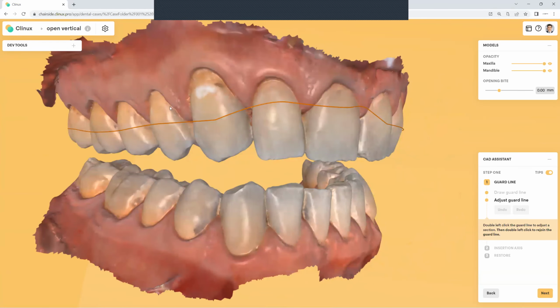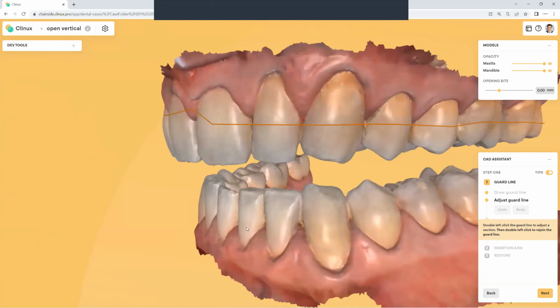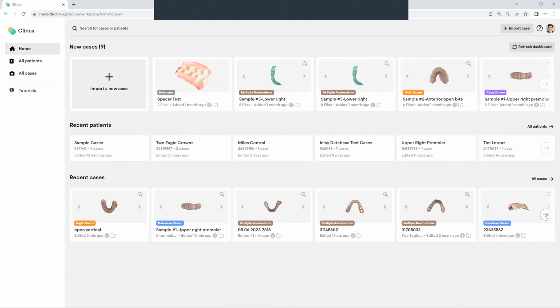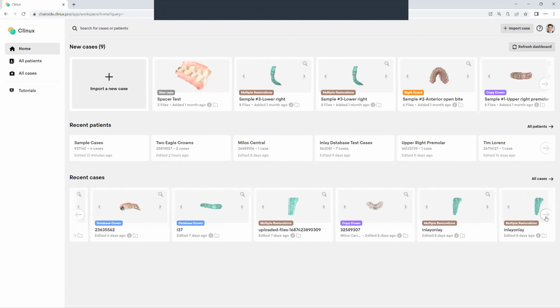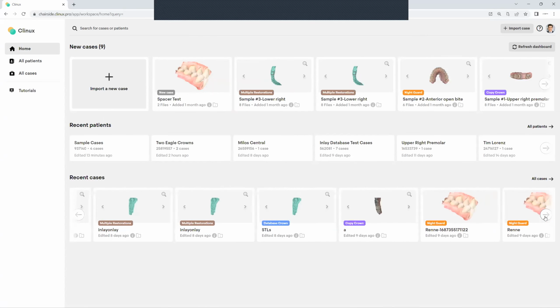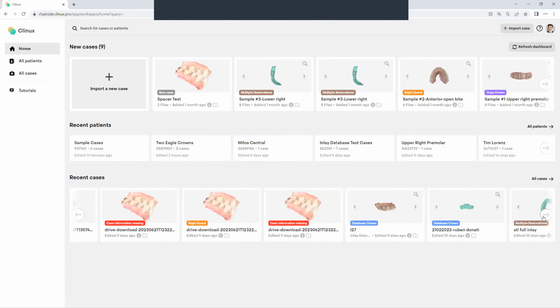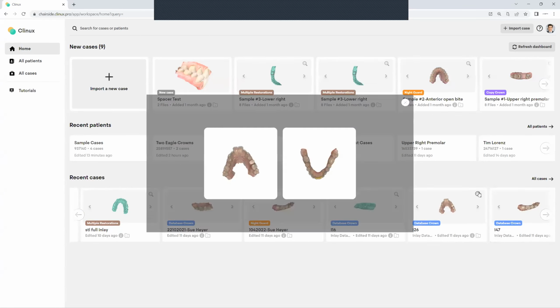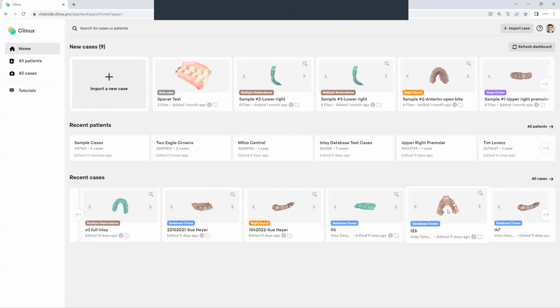Because what happens very often is if you have a bite on only one side or the other, then typically you've already got a wrong angulation on the occlusion. And this will, of course, wedge out that night guard within a very short period of time. I don't know if I've got a case here that shows that really well. I saw a night guard recently, or a full arch case, where the bite was really off. What does off mean? It means that on one side of the arch, all the contacts were blood red, and then on the other side of the arch, all the contacts were light green, you know what I mean? What that indicates, and I don't know if it's this case to be honest with you, but let's just take a look.